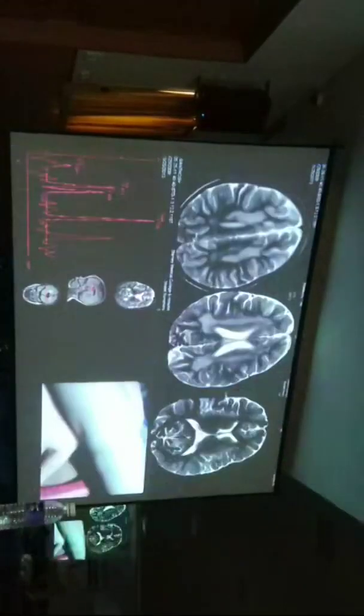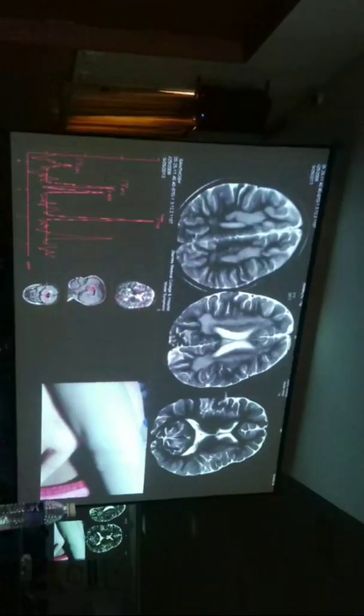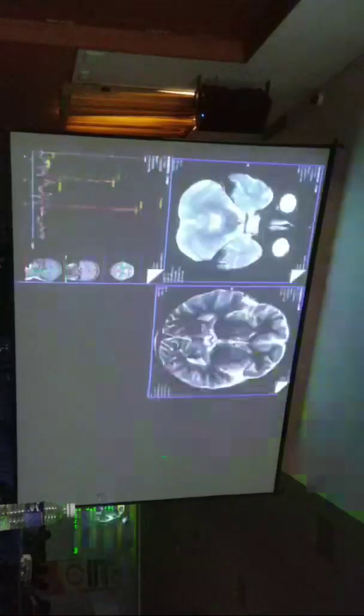This is Canavan's disease. And this is a patient with some skin ichthyosis, you see that, and some non-specific white matter changes. And again, MR spectroscopy shows, what is this peak at 1.3? It is an upright lipid peak. If it is going down, then it is lactate. And this lipid peak confirms it is Sjögren-Larsson syndrome. So you should know that this is a fatty aldehyde dehydrogenase deficiency with the deposition of fatty acid. That is why there is an increased lipid in MR spectroscopy.